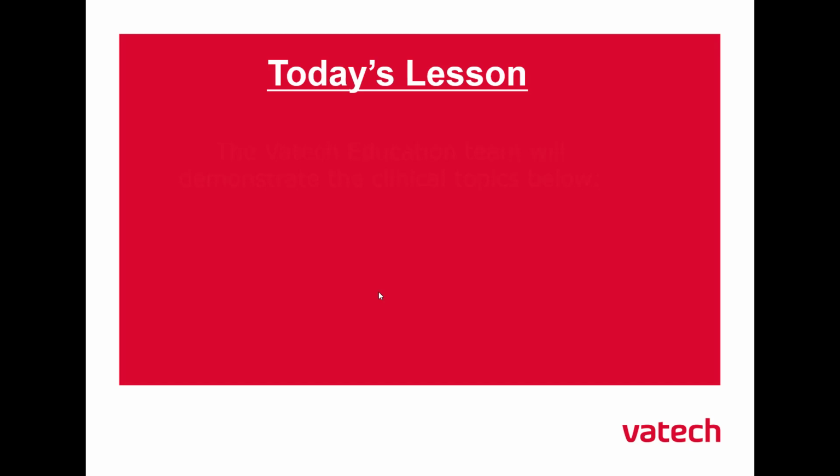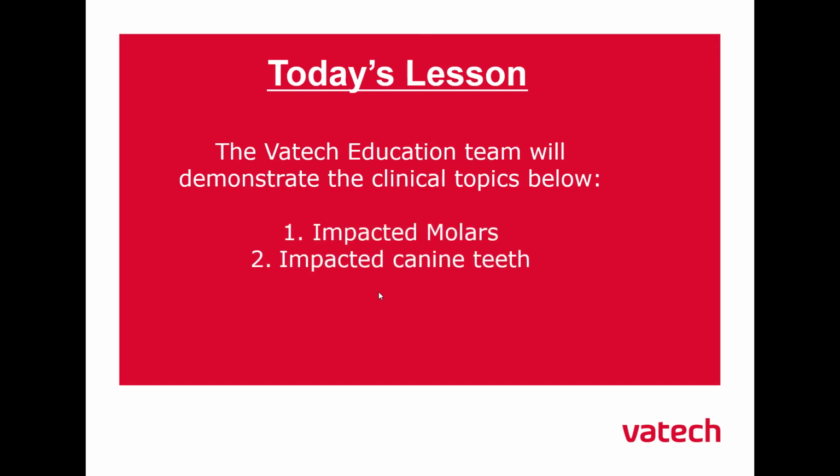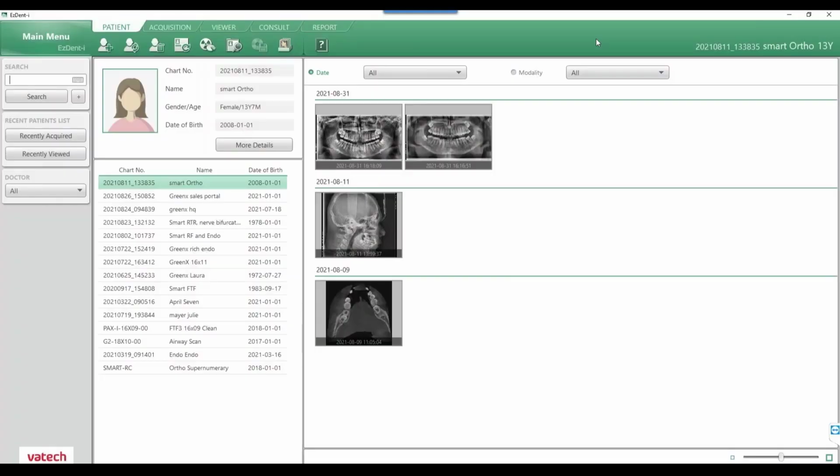On today's Lunch and Learn, we are going to discuss topics as follows in Easy 3DI software: impacted molars, impacted canine teeth, and reviewing mesiodens. So, Jim, what are we taking a look at today?